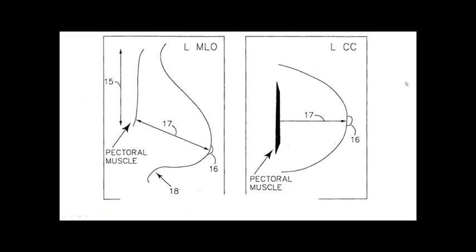All right, let's learn how to do the PNL measurement. This is, like I said, very strict. There's no tricking them when it comes to this. Not that you want to trick them, but they are very wise about this measurement. So you measure from where the nipple attaches to the breast all the way to the back of the image. Let's just say it's 10 centimeters. And then you measure from where the nipple attaches to the breast all the way back to the muscle at about a 45-degree angle, and let's say that measurement is 11. So that would pass. It's within 1 centimeter of each other.